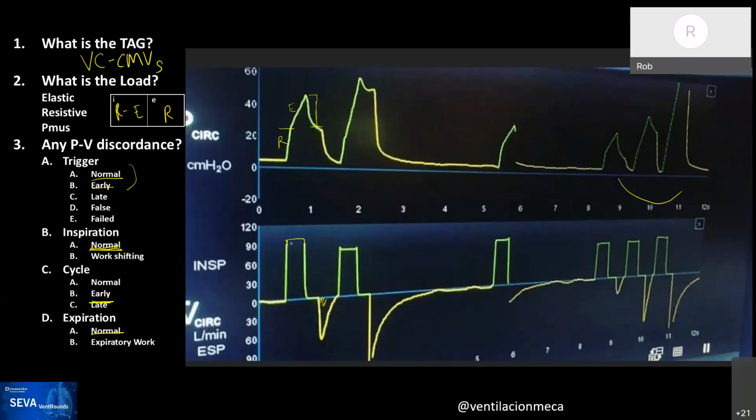Perfect. It's just, most ventilators probably don't compensate that quickly. That's why you're seeing these micro adjustments in flow. Yeah, which I mean, they are not that micro if you see this scale. Yeah. But they are compensations, regardless of the event.